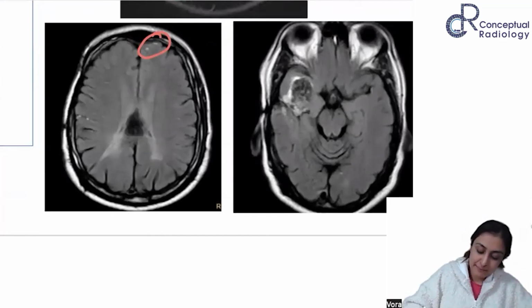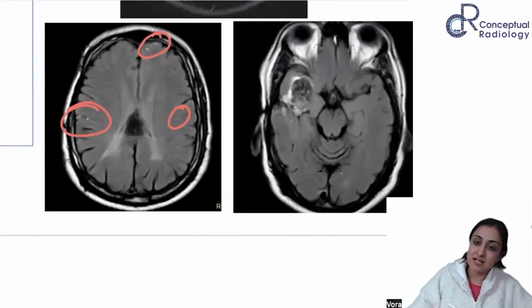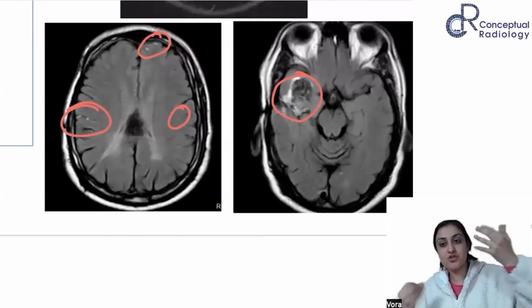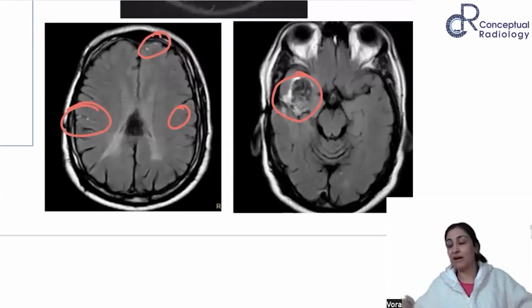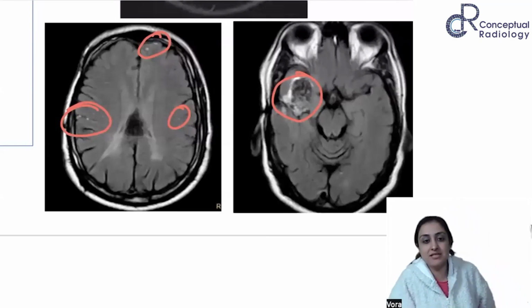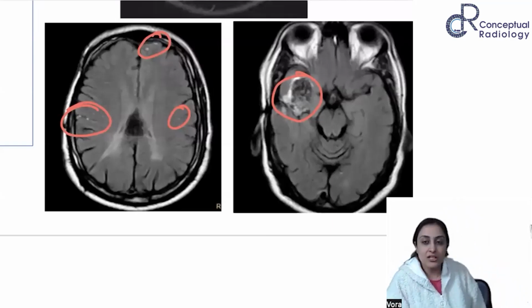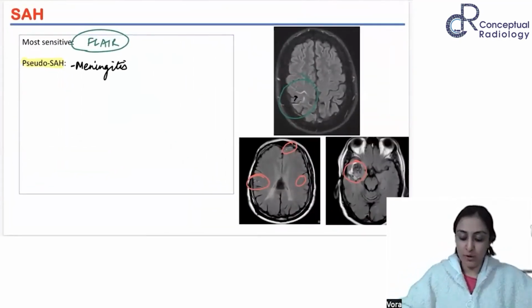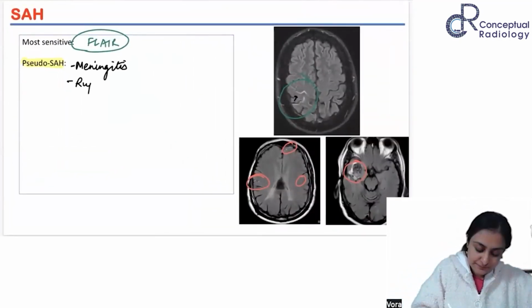It looks like there is hyperintensity in the sulcal spaces, and then we go down here, and you see that there is a dermoid sitting. So a ruptured dermoid, as you know, will have fatty components. So this fat leaks out here in the sulcal spaces, and that can result in this hyperintensity, right? So that is a ruptured dermoid that also you want to consider.